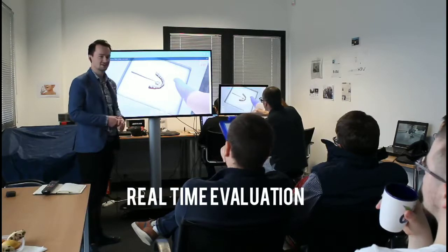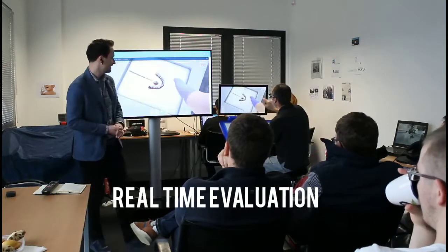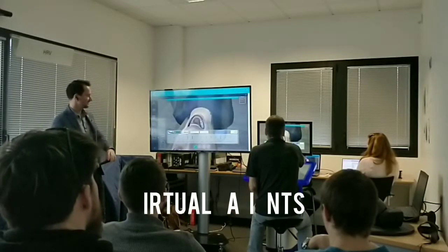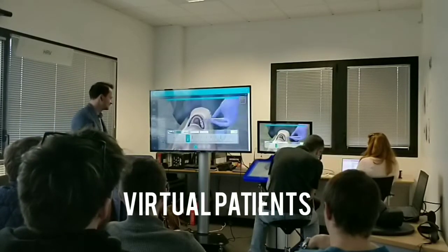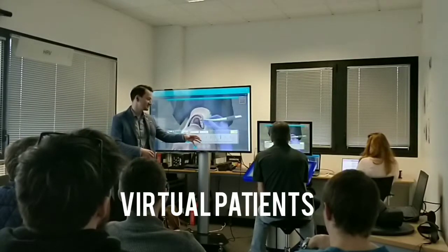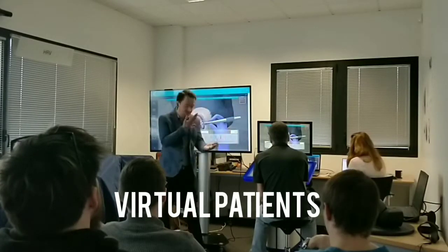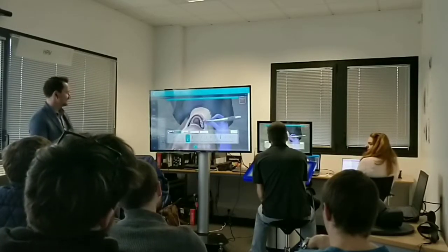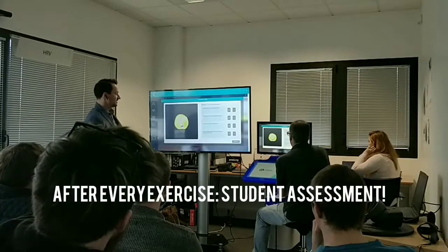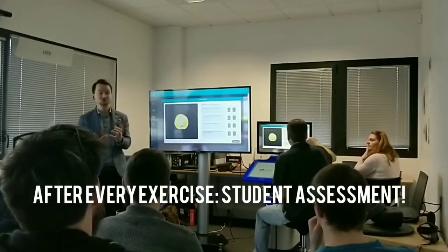Fantastic. After we've done some drilling, we then have a real-time evaluation of everything that's going on. And when we're finished, we can terminate the exercise ourselves around the patient. In blue is the target, the area that needs to be removed. And then using the bottom screen, which allows us that 3D depth of perception, we can look down at this one here, and that'll give us this perception of the teeth. And then we can start an overview of the work we've done, as well as some preset questions that the student can assess themselves on.